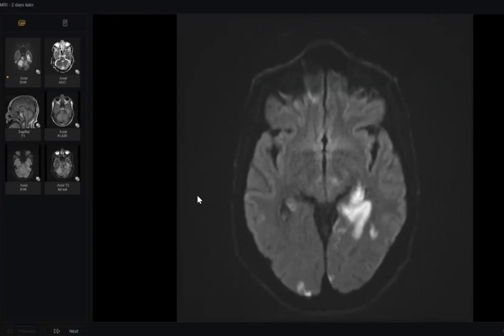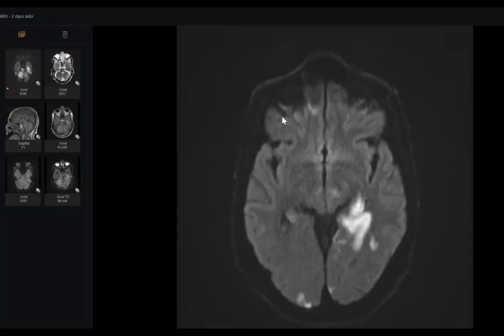What else? What is your next step? Do we have an ADC, sir? Doctor, you confirm this is an acute brain insult. What is your next step? I would urgently inform the referring physician that there are multiple acute infarcts and there is a suspicion of a basilar artery thrombosis. Suspicion, or will the patient need confirmation? One second. Suspicion or it is sure? Are you sure? Yes, it is sure, that it is a basilar artery thrombosis causing multiple infarcts.